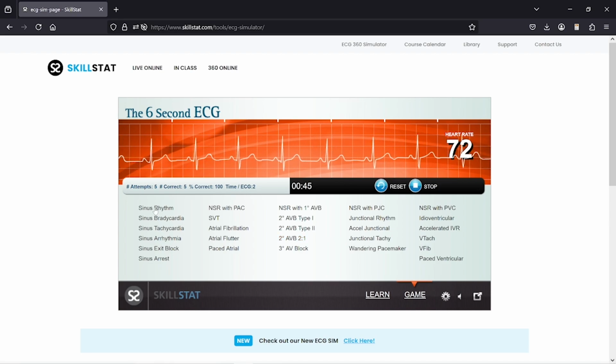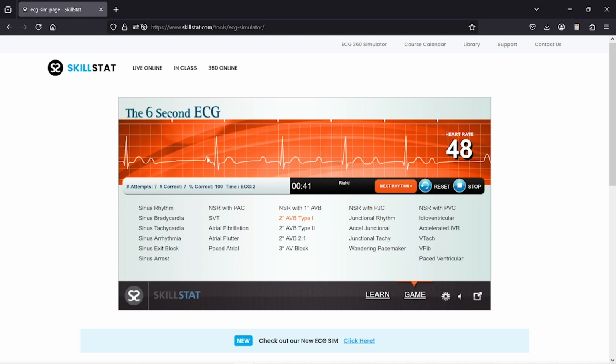Right here, this is a sinus rhythm again. Yep, I should have talked about that. That's just second degree type 1. We can see here that we have the P wave that slowly spreads out, where it starts to spread out. Then we get an occasional 2 P waves as the heart kind of resets. It jumps a QRS complex, and then it goes back into its regular rhythm.